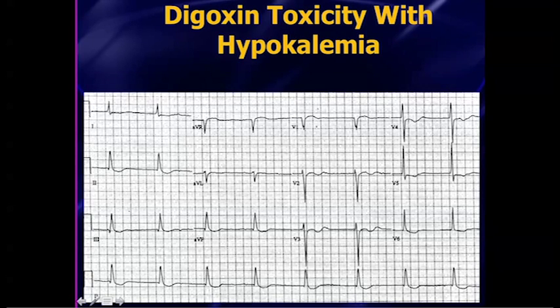And then this is a patient that had digitoxicity associated with hypokalemia. And I'm not going to talk about digitoxicity. I just want to focus your attention on the hypokalemia T waves. Again, a biphasic pattern, but it's a reverse of Wellens with an upward secondary deflection. That's the U wave there. The initial deflection is downwards, then the second deflection is upwards. And out here in the limb leads, just kind of a T-wave flattening type of pattern and long QT.